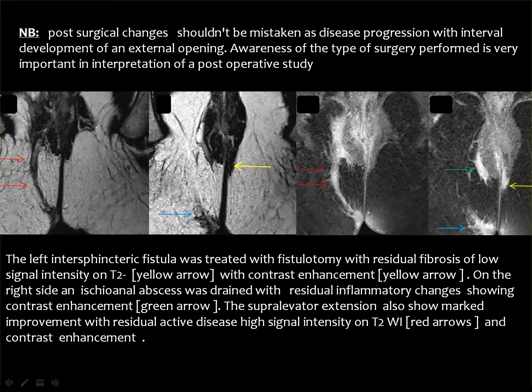One of the important issues is after treatment of the anal fistula, you get some granulation tissue and fibrosis at the site of the healed fistula. If you inject this granulation tissue with contrast, it will enhance. Then you should discriminate between residual activity in the fistula, or an abscess, for example, or this is just healing granulation tissue at the site of the fistula tract.